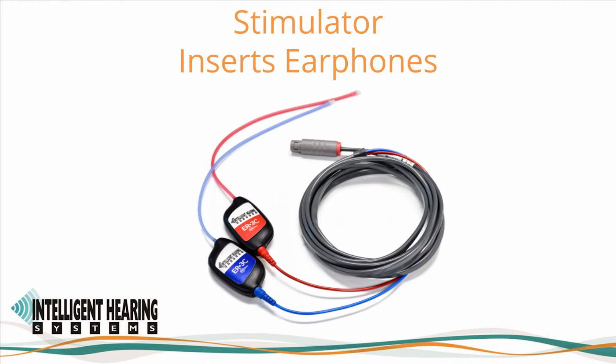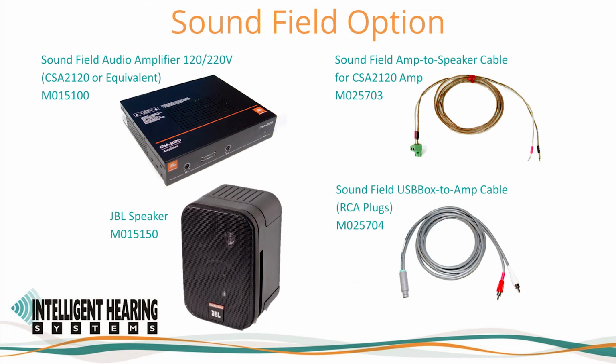The preferred stimulator for the acquisition of CAEPs are the insert earphones, being mindful of possible artifacts. When testing persons with hearing aids or cochlear implants, sound field speakers can be used to deliver the stimulus. IHS offers the following components for sound field option.